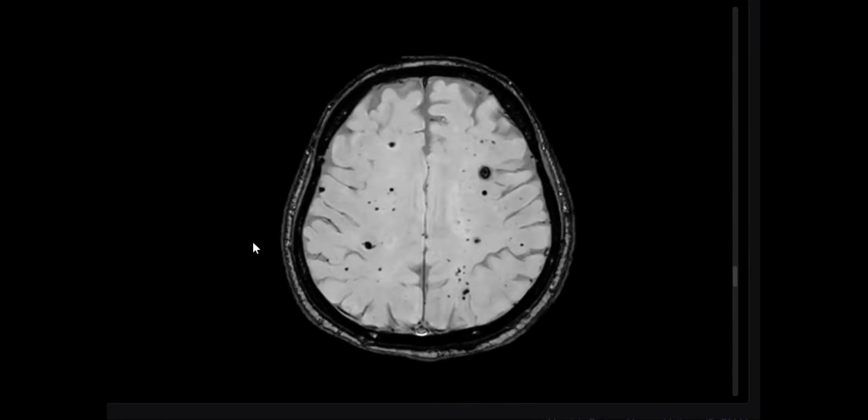So your diagnosis: multiple cavernomas, with any differential of underlying syndrome, multiple familial cavernoma syndrome. Good. Any other cause of multiple cavernoma? The patient has had a previous intervention in the head and neck many years ago. What may induce the formation of cavernomas?